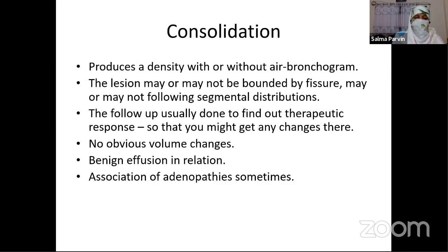And what is the next? There is the follow-up. You can see later whether there are changes of the density or not, and there is really no obvious volume change. This is very important and may be associated with benign effusion. It is also part of our discussion today.